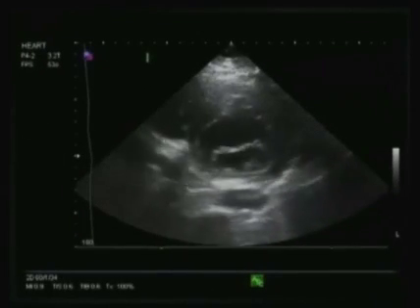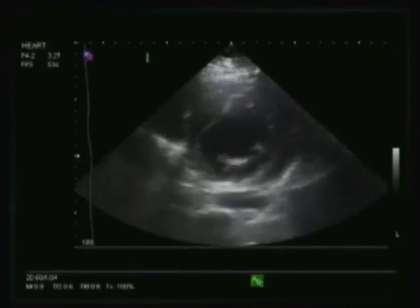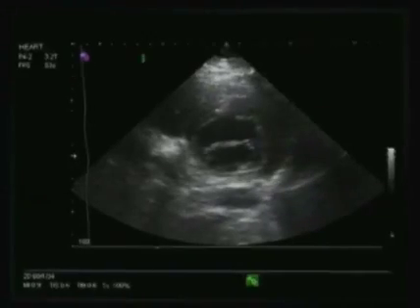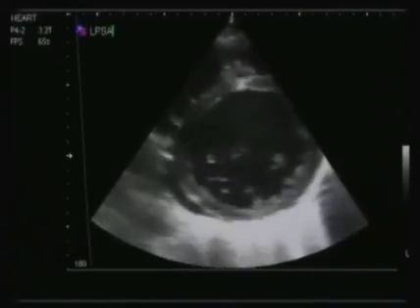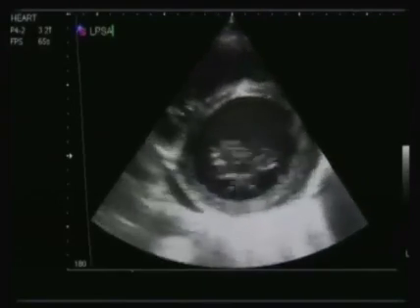Look at a third example, and you can see the squeeze is significantly less. People call this depressed ejection fraction, maybe in the range of 30 to 40%. And in this example, it's severely depressed. There's not very much squeeze at all here, and so it's in the range of 10%.